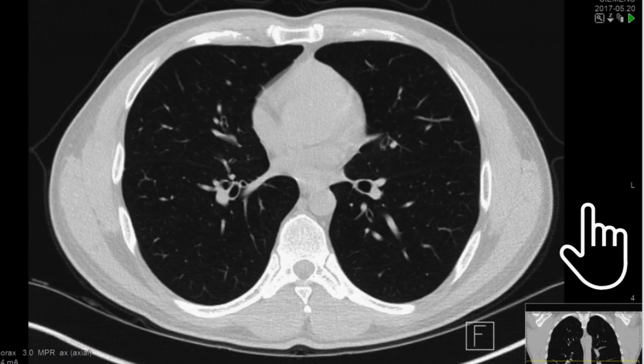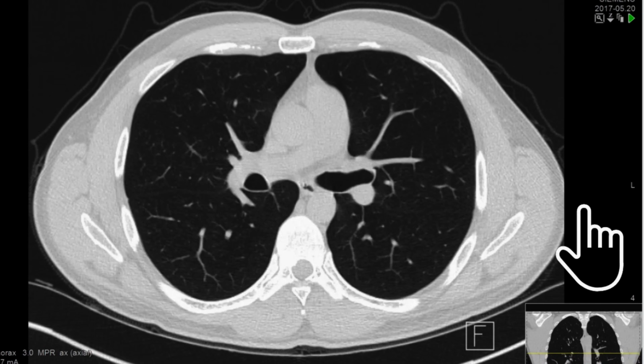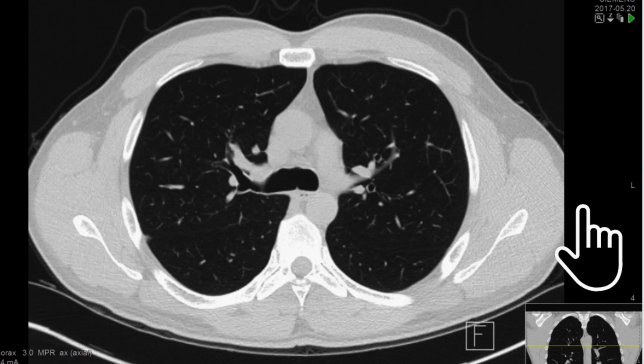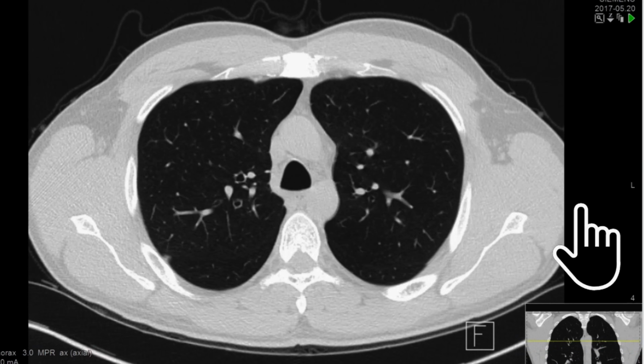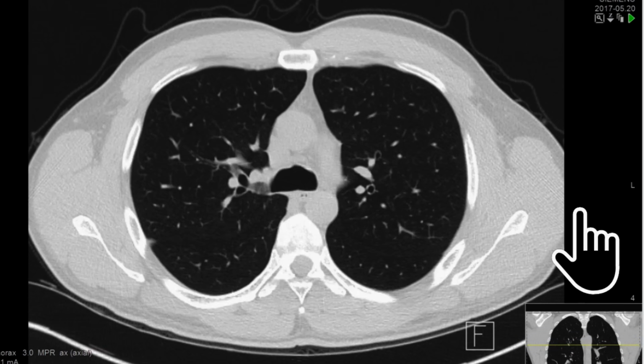There we go. So now we're into the heart. You can see the chambers there. Scrolling back up, watch out for it. There's the ascending aorta. It goes up. It's going to give off some coronary arteries. I'm not going to identify here. It goes up, becomes the arch, and then drops down. The other side is the descending aorta.